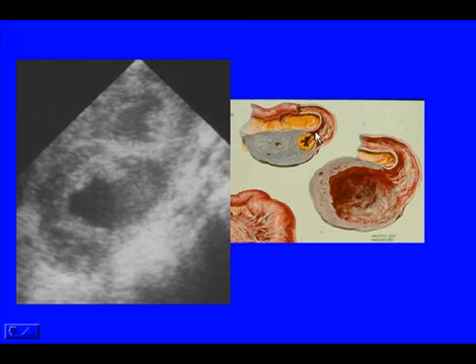But after continuous spillage of purulent fluid into the periovarian region, the ovary does get infected, and you can see nicely on this transvaginal study, which correlates nicely with the Netter diagram, the dilated fallopian tube with complex or heterogeneous fluid within it and penetrating into the ovary, infecting the ovary.